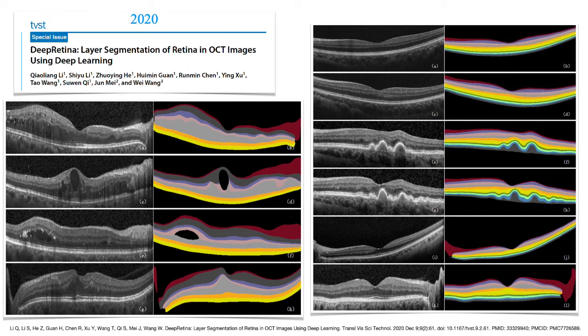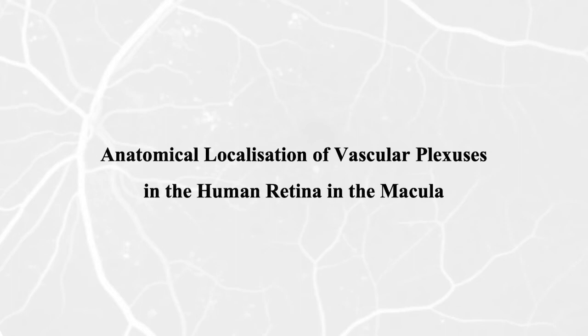So when we have a sort of swelling, so there is some edema, the software is able to recognize exactly where the fluid is located and quantify the thickening or thinning of each of the retinal layers involved. And same where there are some drusen, or at least disruption, alteration of the outer retinal layers that of course also involve the inner retinal layers, like in this case when you have drusen, each of the retinal layers like the outer nuclear layer and outer plexiform layers are involved by the presence of the drusen.